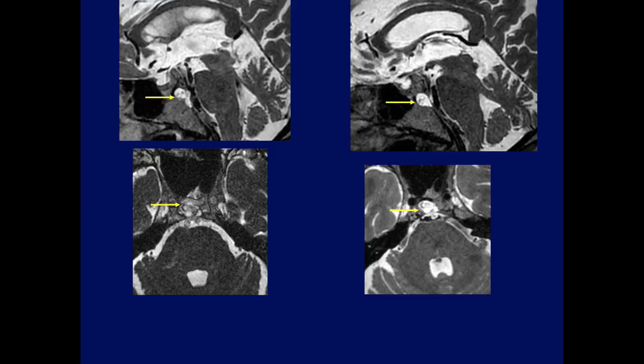Okay, what is this unusual case with a very peculiar name? Very good. Anshu came up with this very hard name to remember. This is Ecchordosis physaliphora, which is actually a remnant of notochord.